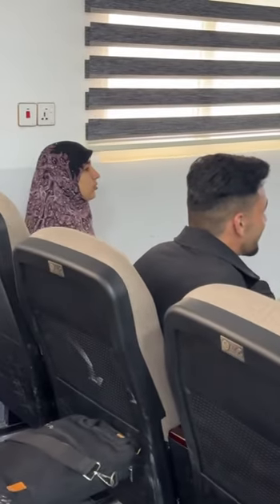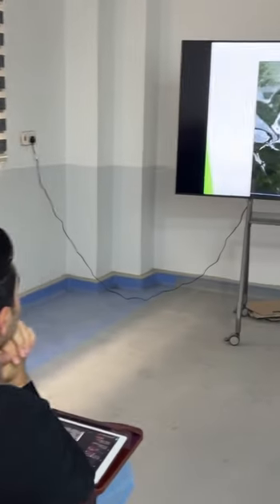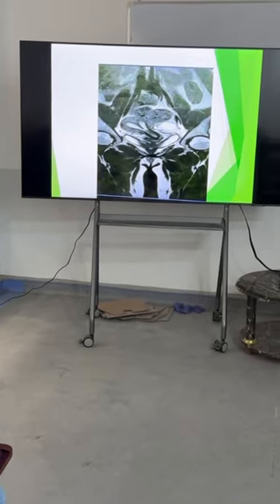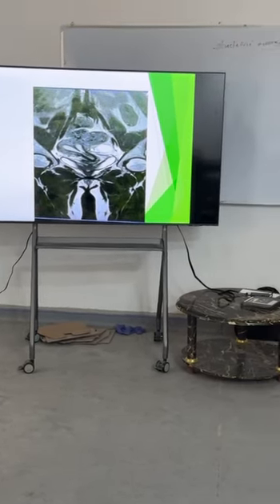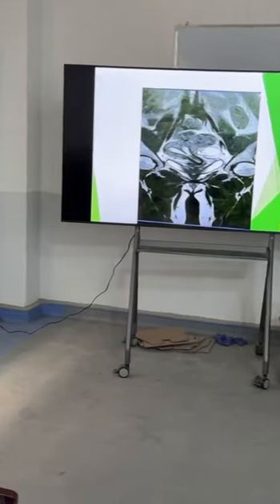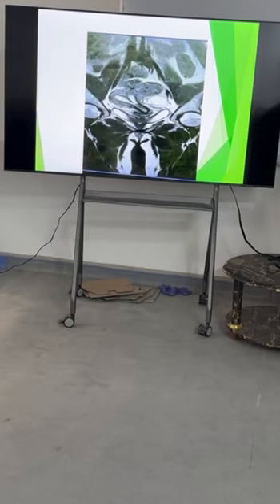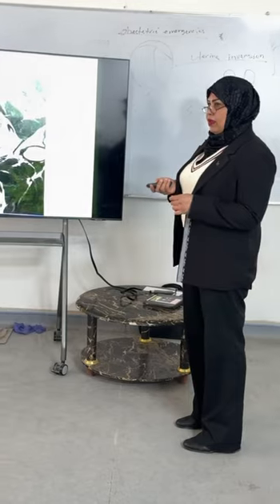Yalla. What is the type of study? This is MRI. Which study? T1, T2? Which one? T2. Why? Why? You have no idea? Any fluid can appear hyperintense in T2 and appear signal void and lucent in T1.